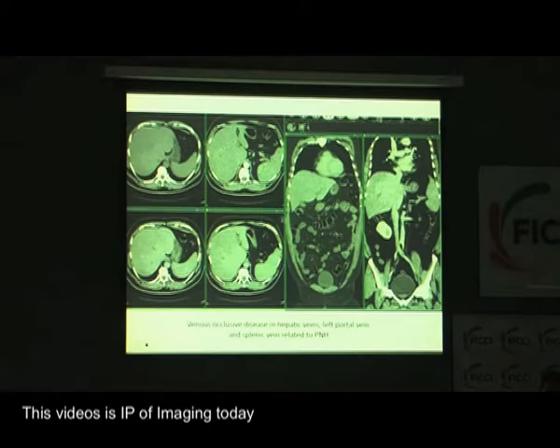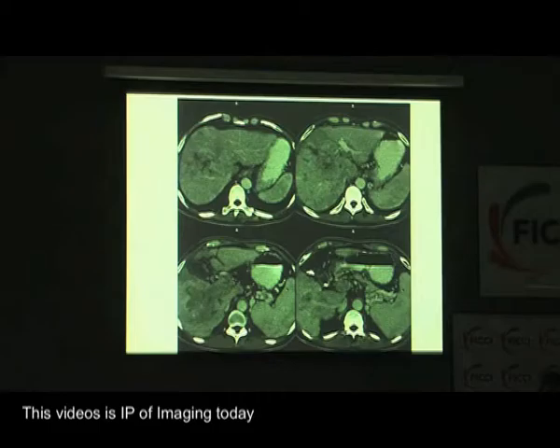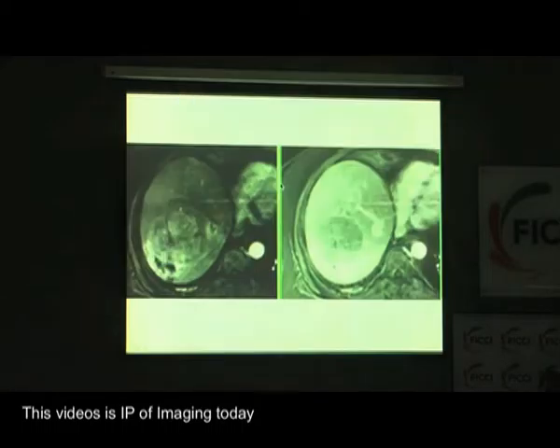And the left hepatic vein was relatively spared, which is why you can see that parts of the posterior segments of the right lobe and the left lobe were showing better enhancement. In fact, there was also thrombosis of the splenic vein. And both hepatic and splenic vein and systemic thrombosis can be seen in patients with paroxysmal nocturnal hemoglobinuria, which is what this patient had. He has an HCC with portal vein invasion, and you can see that there is differential enhancement of the left and right lobe, again secondary to portal vein thrombosis.